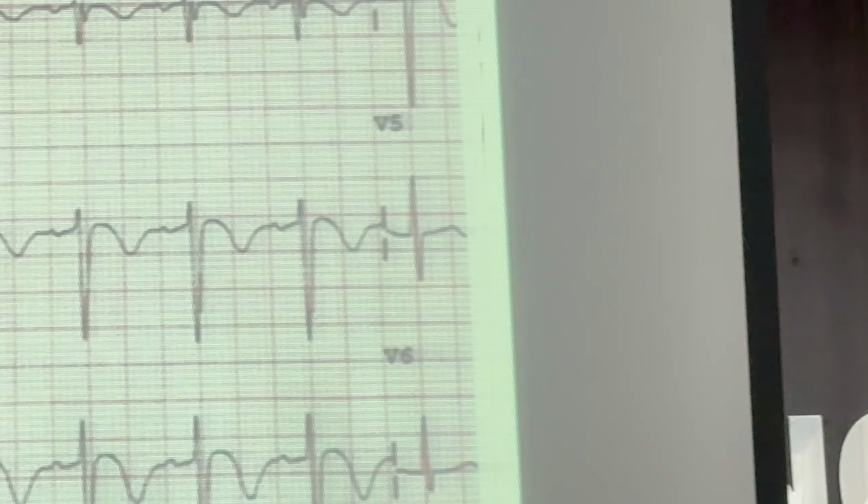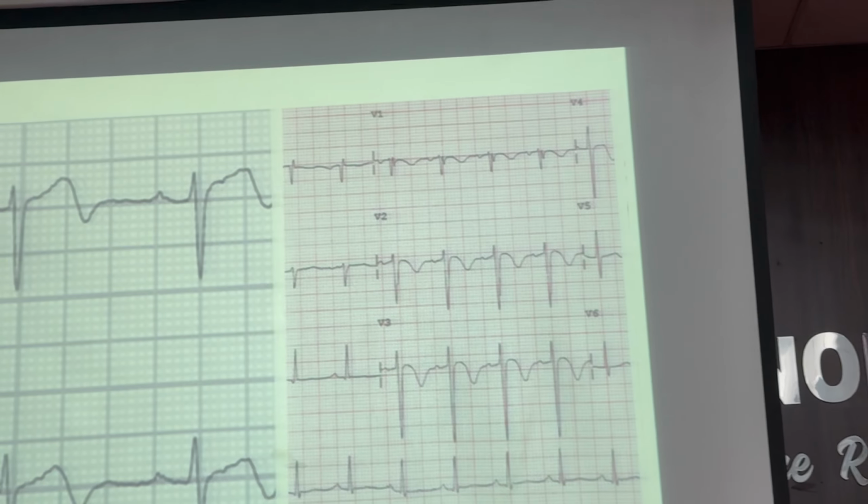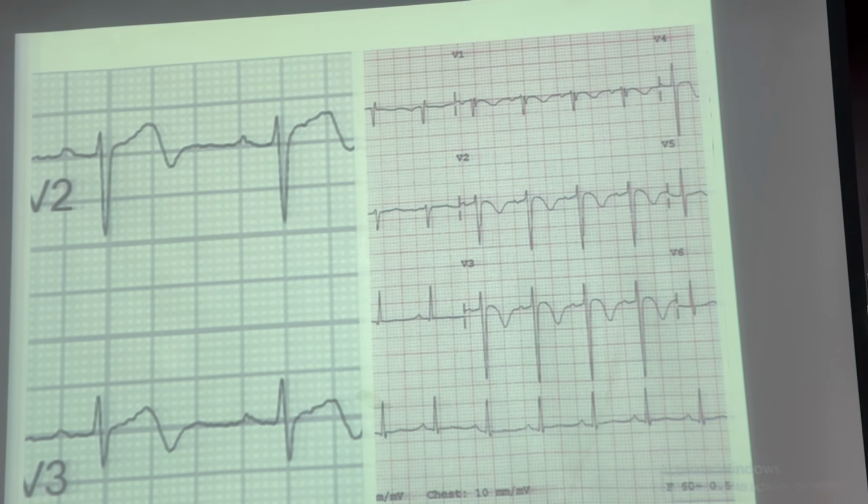Right. So we will move on to the high risk ECGs. Now the STEMIs are over. So everyone knows Wellens. So this is type 1 and type 2. It is easy to spot these T wave abnormalities, but you should make sure it's Wellens.